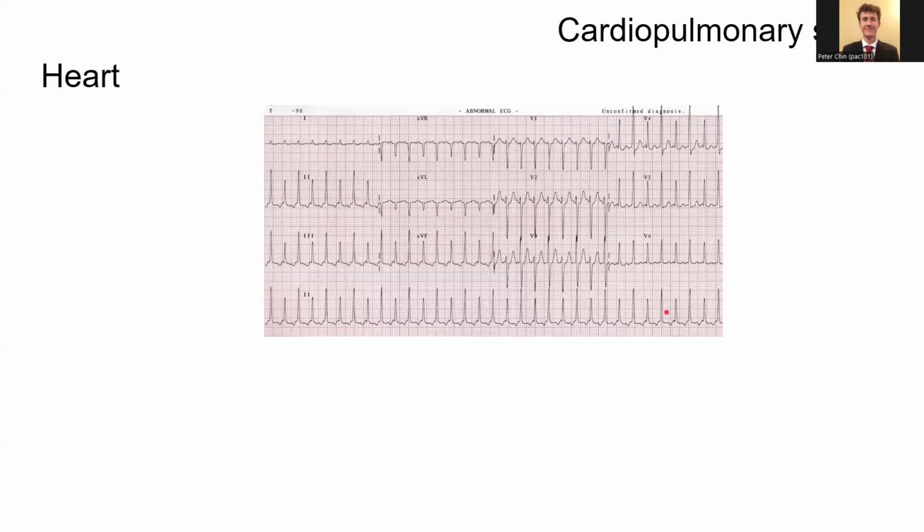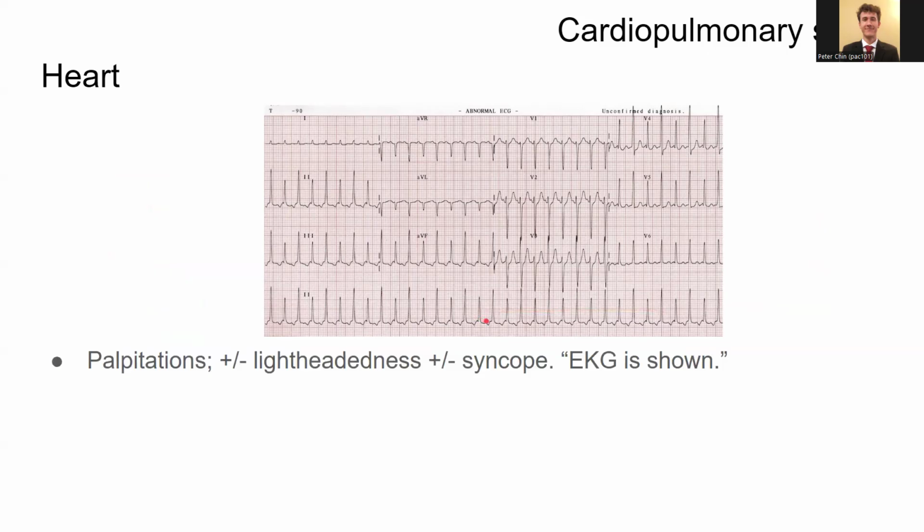All right, so we're going to move on to a couple other EKGs. Same deal as last time. I'll show them, we'll get the diagnosis of each, and then we'll compare. So here's this EKG. Again, the patient will present with palpitations, lightheadedness, maybe syncope. EKG is shown. So if you'll look at this EKG, since I've seen this one before, I know what the answer is. But like I said, we'll go over it.